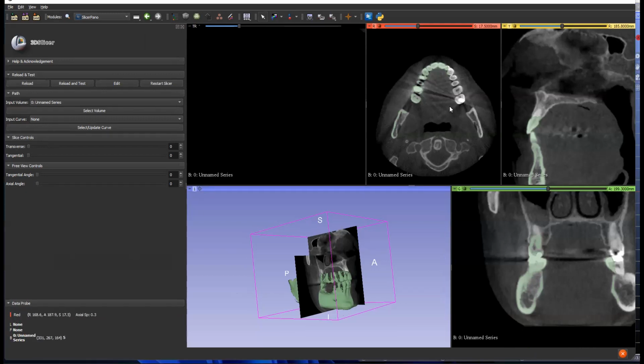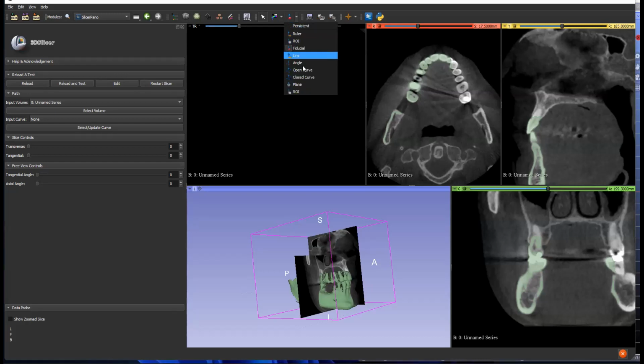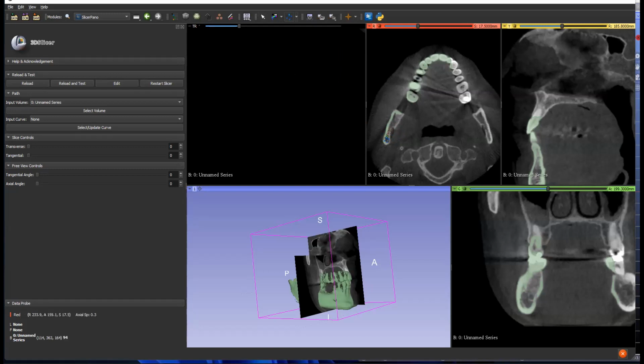And at the moment, we don't have a curve. Now we need to draw a curve, and that's quite easy. There's like a little red dot over here. Click on that sign and then open. You'll see open curve. Don't select close curve. Click on the open curve and then plot your curve.